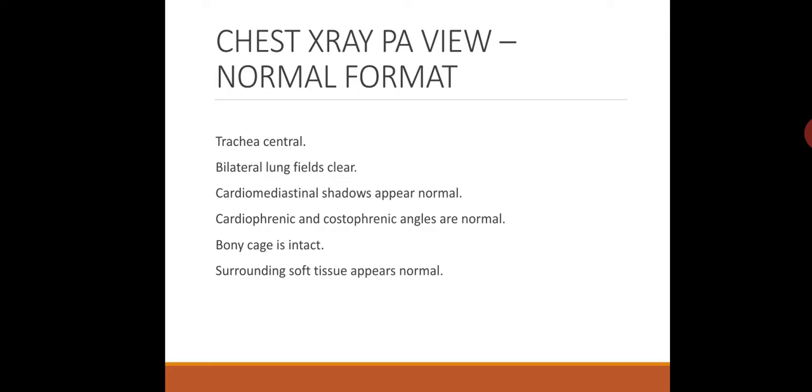So when we look at a chest X-ray, PA view or AP view, there are some things which we should definitely look at and report thereafter.